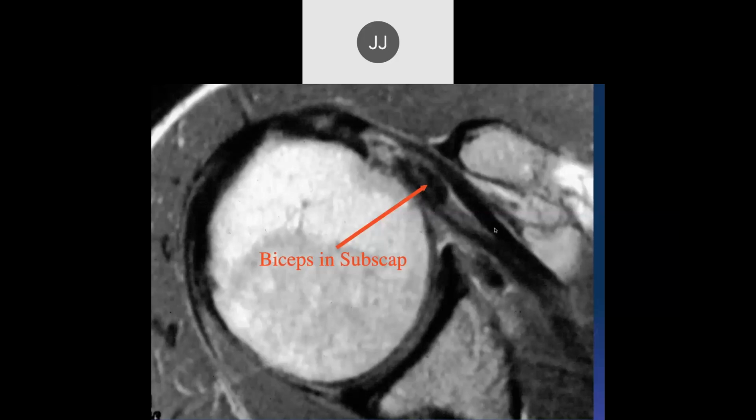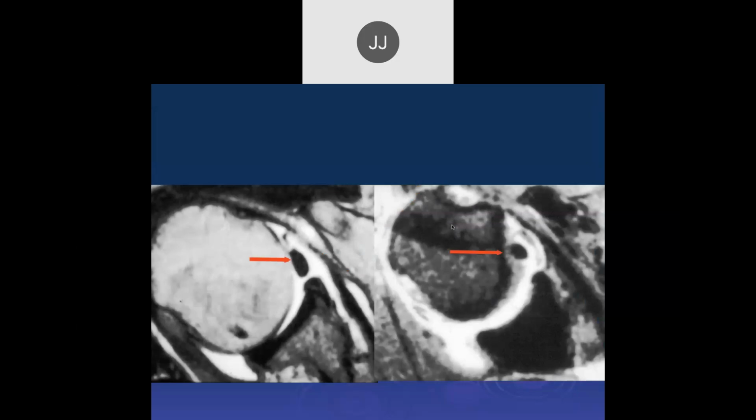No, I see on that one, the inferior margin of the subscap has a very thin layer left, but the next slide that you have, that one, how did that get there from up there? Did it go over the superficial fibers, over the top of the tendon? No.